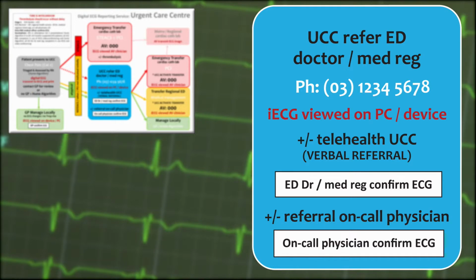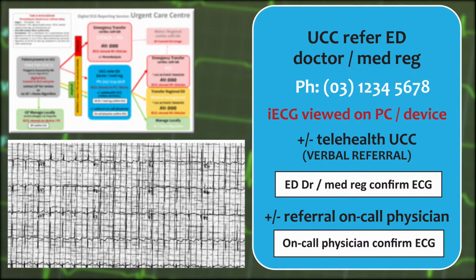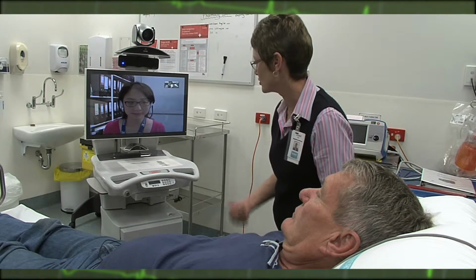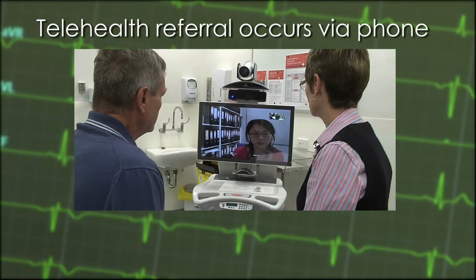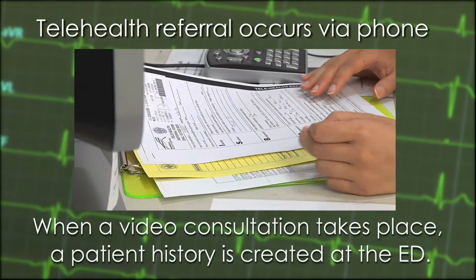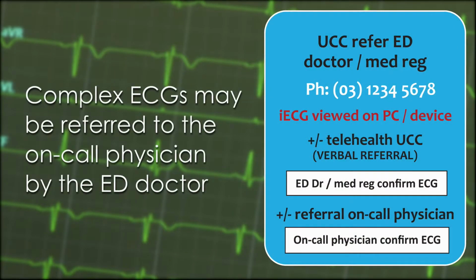For ED doctors and physicians, they can remotely view high-quality digital ECG images on the server immediately, instead of relying on faxed or photographed images. A video consultation may be required for more thorough assessment of the patient. Referral will occur through the verbal discussion between the referring nurse or GP and the ED doctor. In addition to reporting within the iECG system, details of the video consultation will be entered in the patient medical record at both health services, consistent with national guidelines for telehealth. The ED doctor may refer complex and difficult to interpret ECGs to the on-call physician.